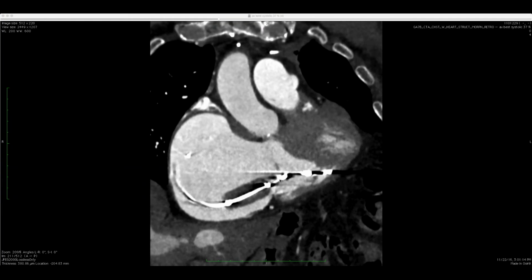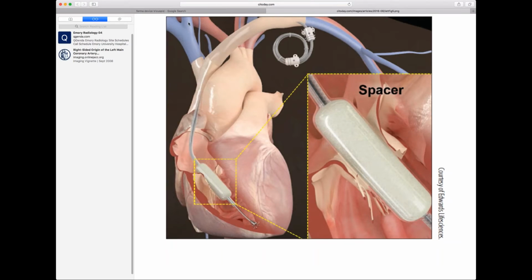Let me show you what that looks like. This is an artist's rendering of the Forma device. I was showing you that the anchor is displaced because it's not at the apex, and it's supposed to traverse the tricuspid valve, reducing the area across the valve to some degree and also giving the leaflets some surface on which to coapt.